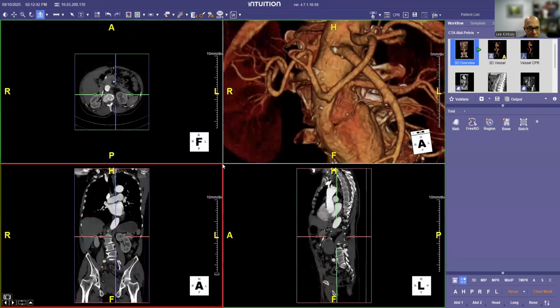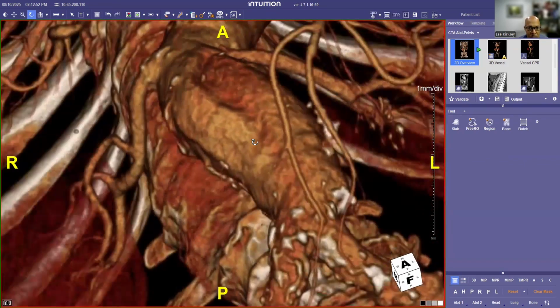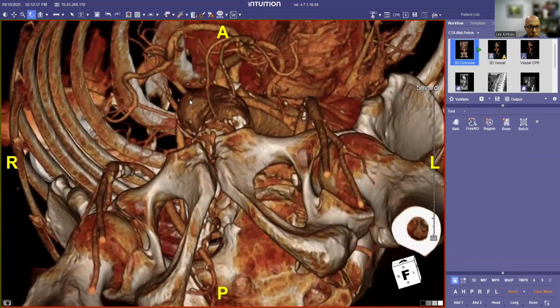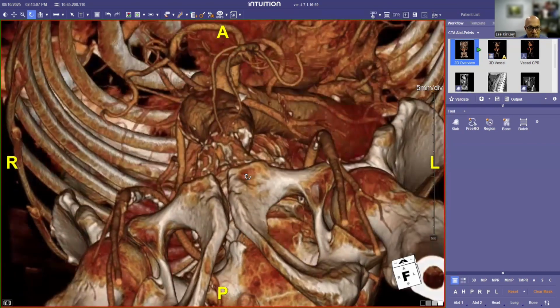Using this same technology, we can look at the blood vessel in a cross-sectional view. Imagine a patient is lying here on the examination table, and right now we're looking up through the patient. So imagine the feet are at the bottom of the screen. My cursor is pointing towards the pelvis.